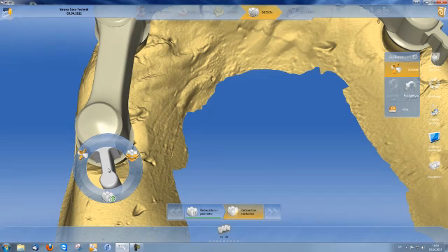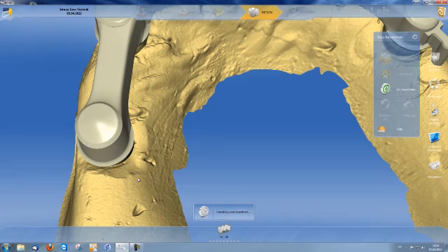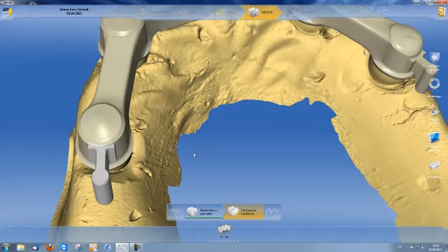If the attachment has changed completely, for example, it is possibly outside of the telescope angle, I would now have the chance to click on Recalculate, and the attachment would be aligned again according to the first proposal.